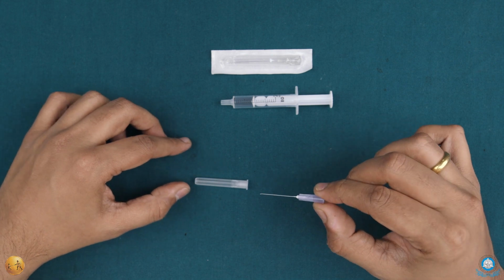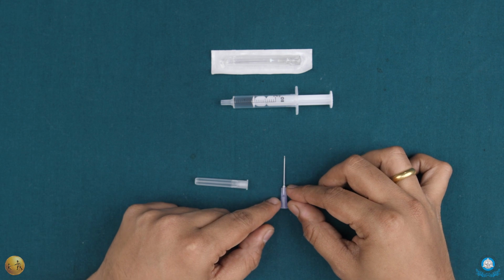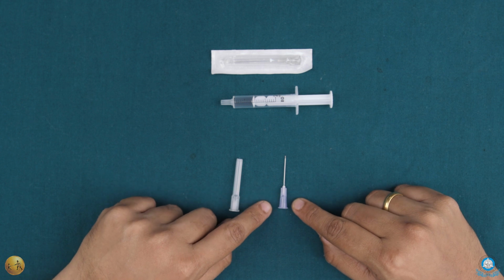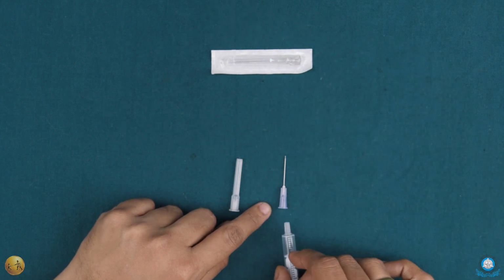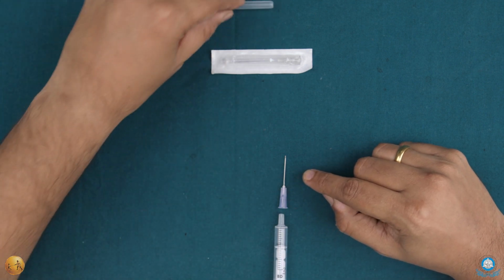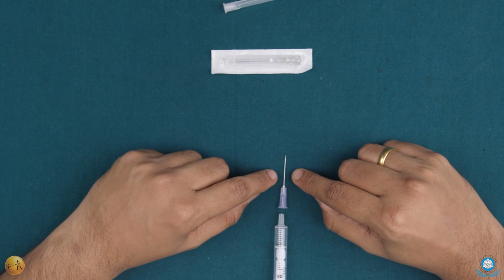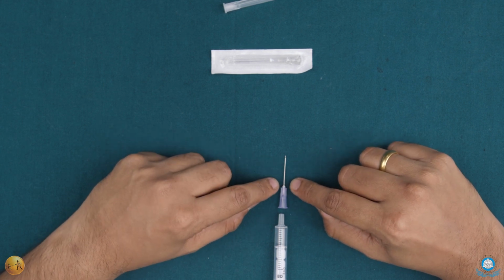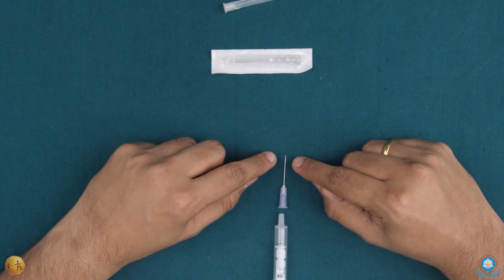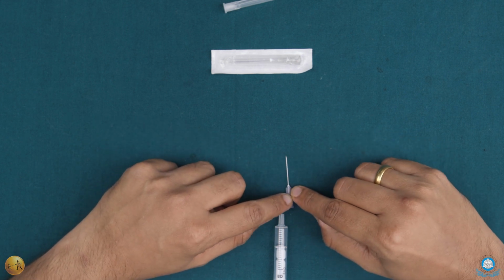Now, if you notice, this needle has the configuration of the adapter, that is the plastic adapter that goes onto the actual syringe, right? You then have the white part of the needle adapter, which is actually holding the metallic needle in place. That is called the hub of the needle. You then have the barrel of the needle, and eventually you have the needle tip, which obviously has a bevel.